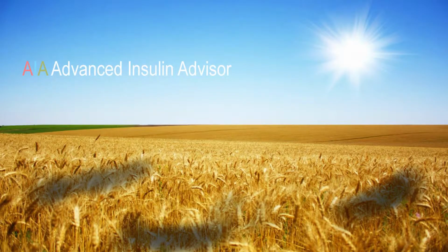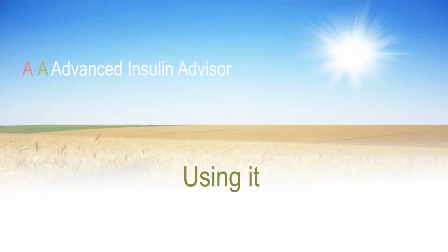Advanced Insulin Advisor. How to use it.